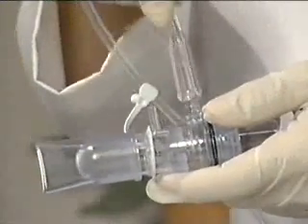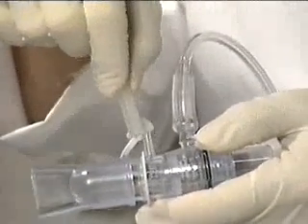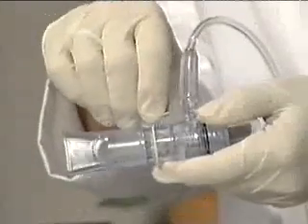Setup is easy. First, connect one end of the tubing supplied with the EzPAP to a 0 to 15 liter per minute flow meter that is connected to a 50 to 60 psi medical air or oxygen source. Next, connect the patient end of the tubing coming from the flow meter to the EzPAP gas inlet port. Then connect tubing from the EzPAP pressure monitoring port to a pressure gauge. This is recommended for the initial setup to monitor the pressures transmitted to the patient. If pressure monitoring is not being done, seal the port with the attached pressure monitoring port cap. The pressure monitoring port should not be exposed to ambient air while in use.